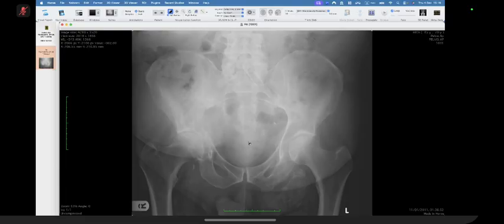Otherwise, for the calcification overlying a soft tissue with this configuration, myositis ossificans would also be in my differential list if there is a history of trauma. And these findings need to be communicated to the referring physician. The patient can be further evaluated with a CT for confirmation of the finding, and the orthopedic referral or fracture clinic can further be informed about this patient.